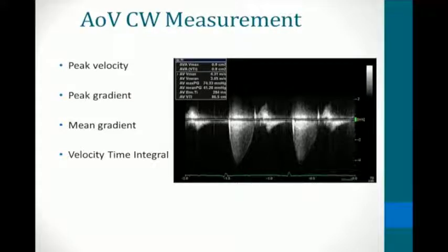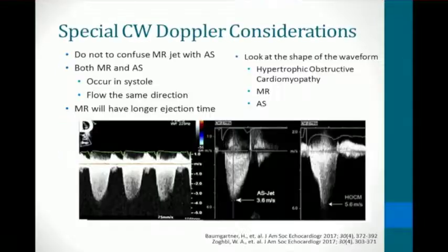If it's very challenging to find the velocity, using an imaging enhancer may help to bring out the signal. Though a word of caution: do not measure feathering in the Doppler signal, and optimize your spectral Doppler display. One reason is because it will make the patient's pathology worse and possibly send them to surgery before they need it. The second reason, these patients are typically followed closely with serial echoes, so the next sonographer is going to be pulling their hair out trying to match a false measurement.